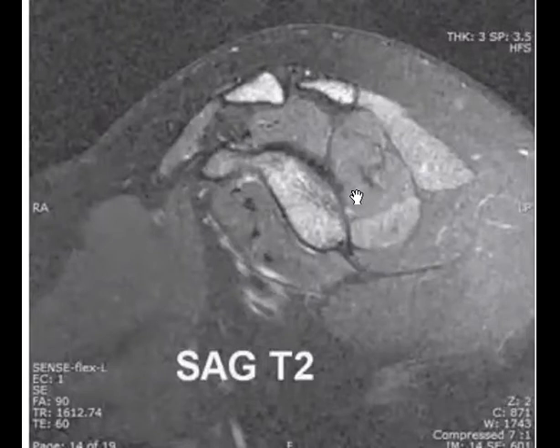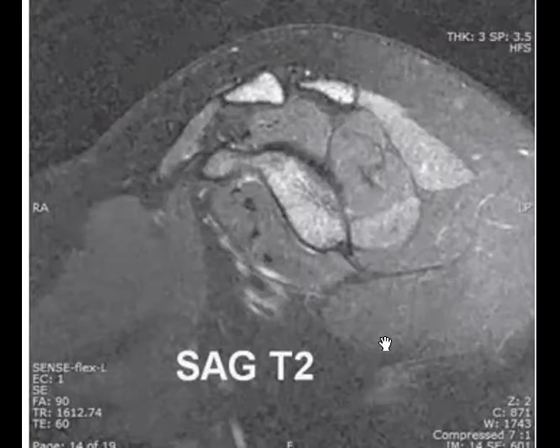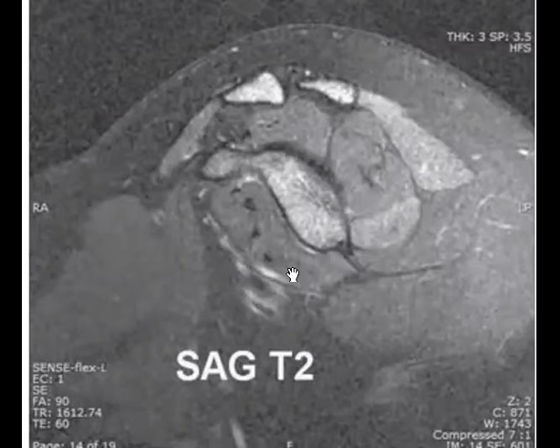So this means that, yeah, I agree with you regarding the edema, yes. But later on, maybe it can have what is called fatty infiltration, yes. So now we have edema, and this is what is called denervation, yeah. Denervation, so start with edema, then maybe end with fatty atrophy and infiltration, yes. And this is what is called, as you mentioned, Irene, quadrilateral space syndrome.